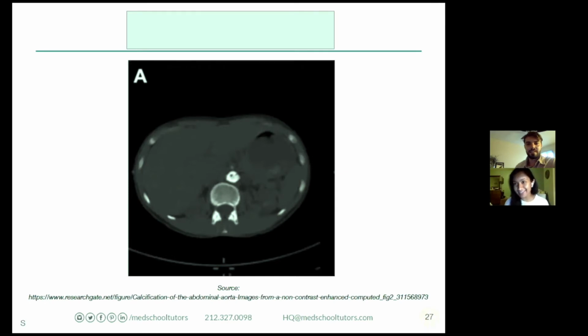It is, again, the vessel immediately anterior to the vertebral body that I'm looking at. So here, I'm looking at the vertebral body, right? And this is the only thing that's really jumping out at me. I'm not seeing a clear additional anything else. So we're seeing a circular structure immediately in front, a touch to the left, not really surrounded by the liver. So this has to be the aorta, right?